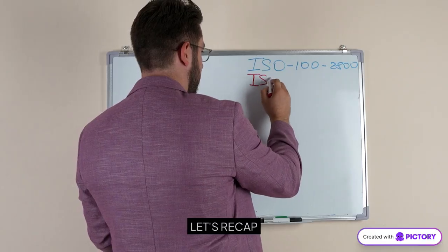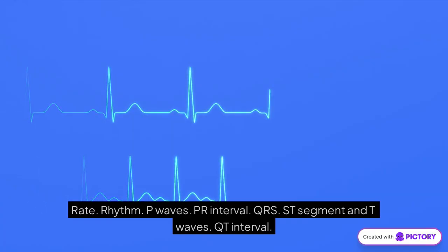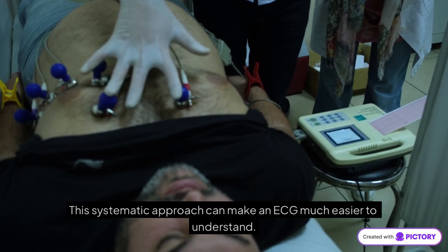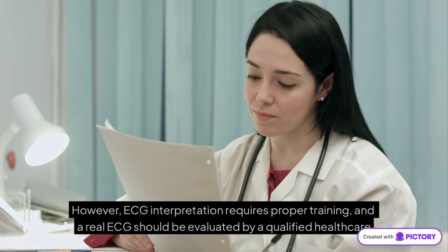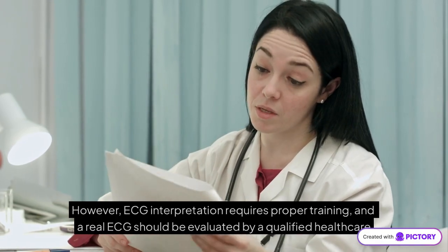Let's recap, so remember: rate, rhythm, P waves, PR interval, QRS, ST segment and T waves, QT interval. This systematic approach can make an ECG much easier to understand. However, ECG interpretation requires proper training, and a real ECG should be evaluated by a qualified healthcare professional.